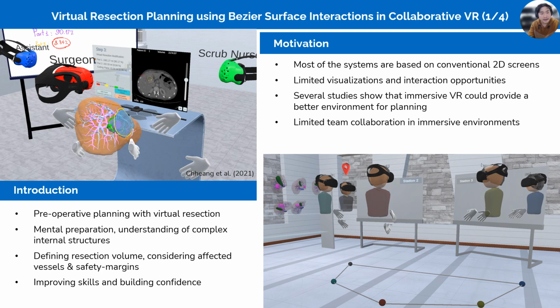Preoperative planning is based on a stack of medical volume data representing the image slices of the organ acquired from an MRI or CT scanner. While 2D images of the CT or MRI data provide anatomical detail, 3D visualization offers an even better overview of the large-scale features and general configuration.